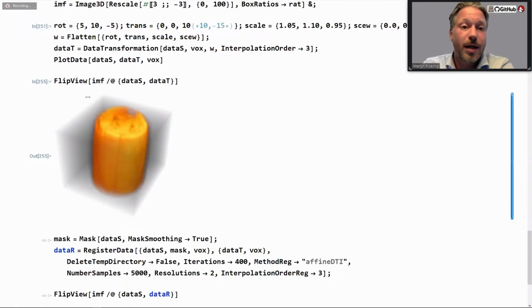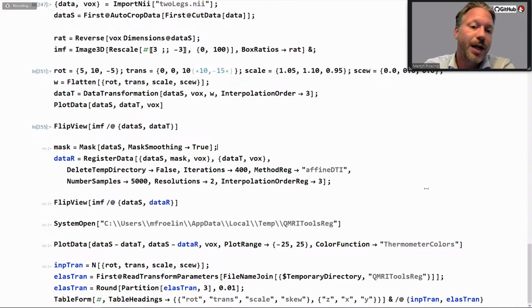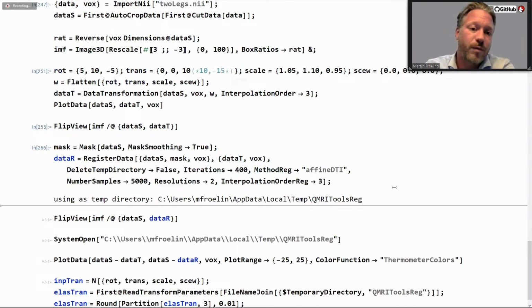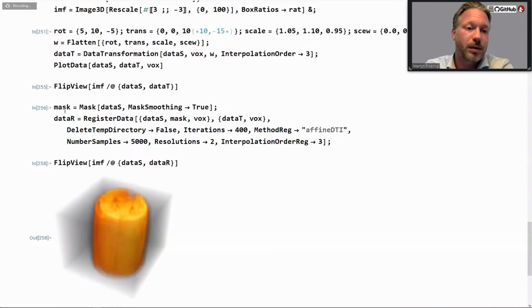Within the mathematical language, you have the option to do, I think it's called image align, but for registration, I use an external toolbox called Elastix, which gives me larger flexibility. So I have my original data set as a target and my warp data set. Now I've registered it, and hopefully the registered data set is aligned with the original data set perfectly.